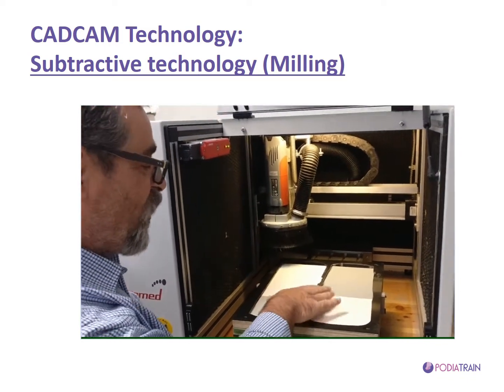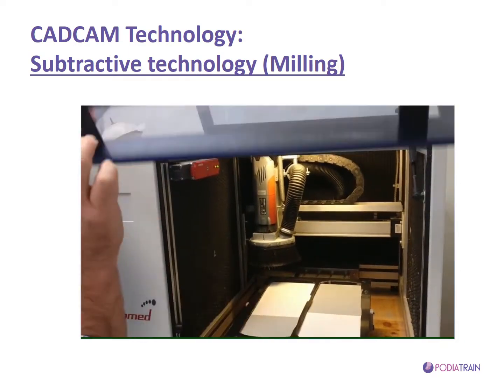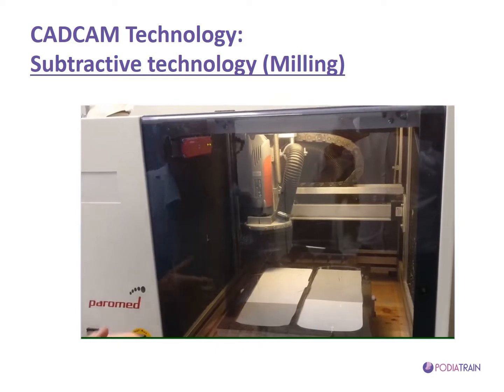I have already loaded the 2 blanks here, so all I need to do is just close the machine and switch the machine on.